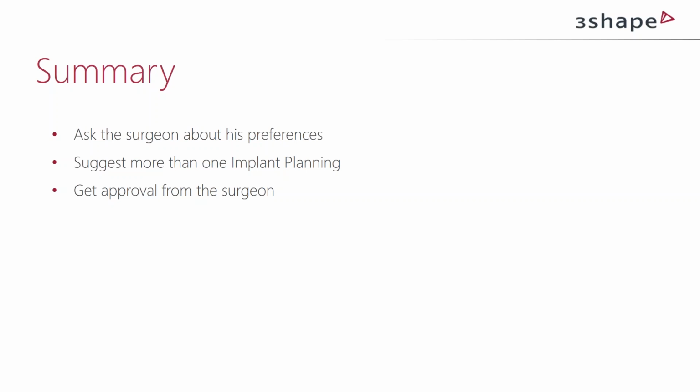So take this webinar to your surgeon, sit down and talk about these things: which implant system they prefer, why they prefer it, which implant kit you are using and so on. Inside Implant Studio, when you choose the implant, you can already choose whether you want to use just a drill guide or a fully guided surgical guide where you can place the implant through the guide as well, so you get the right height and depth position.